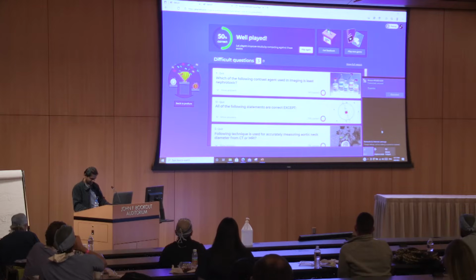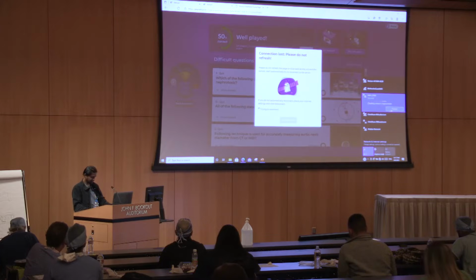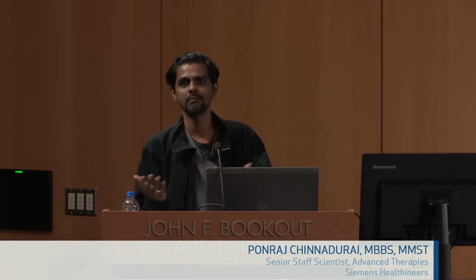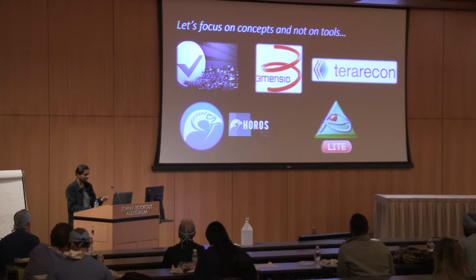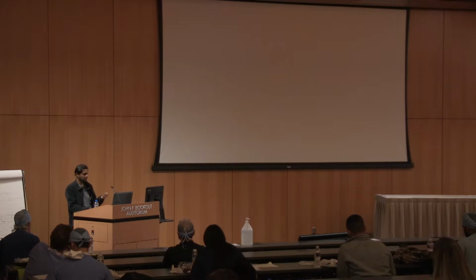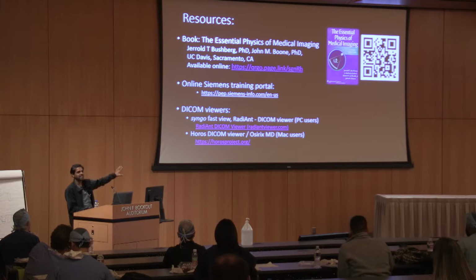So let me switch to the hospital network so I can access images in PACS. Okay, got it. So the goal here today in the next few sessions is, even though we are using a specific Siemens tool, there is nothing Siemens-specific algorithm that I'm talking about here. The focus is on the concept, not on the tools. So you can pick the tool, whatever you are comfortable with or have access to in your hospital or on your PC. And this is probably the most important value add you can take out of this lecture.